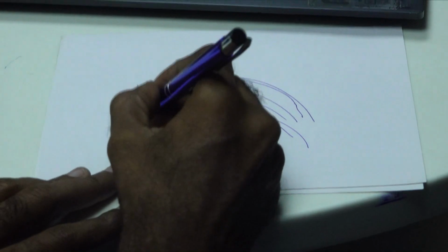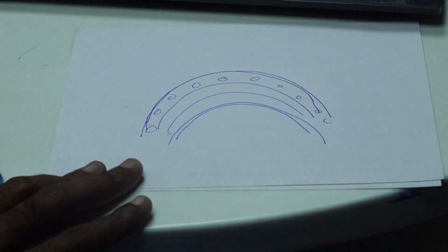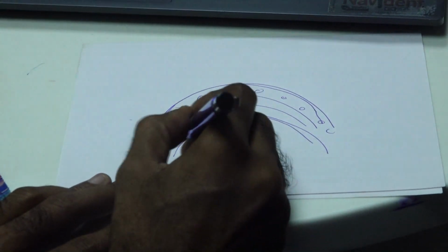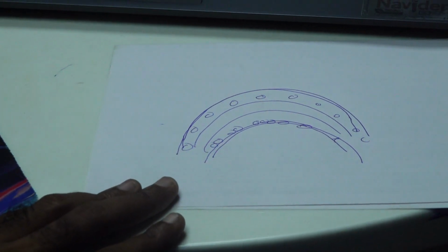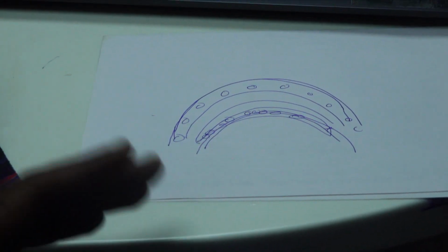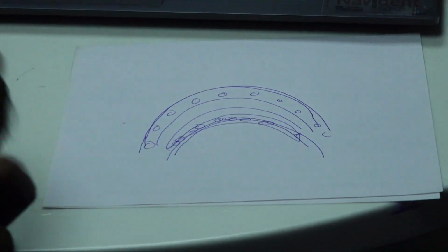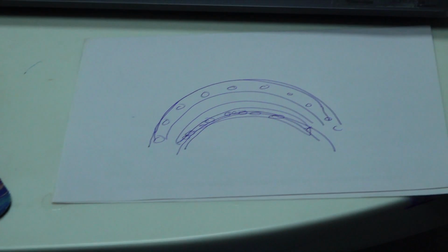This we should understand. By seeing the OPG, we can plan 1, 2, 3, 4, 5, 6, 7, 8, 9, 10 implants. But when these implants reach the nasal floor segment, they will be very close to each other or hitting each other. So this we should keep in mind. The number of implants possible and the safe inter-implant distance, especially at the nasal floor, should be planned so they are not touching or hitting each other.